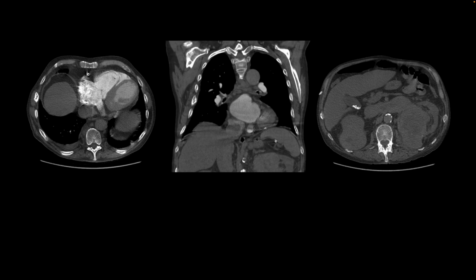This is our next patient where the finding is in the kidney, and they have a renal cell carcinoma that has grown through the renal vein into the IVC, and we see that finding over here. Also, the IVC is expanded. And so pay attention to abdominal organs. They may have a pathology which may lead to PE-like signs and symptoms, and patient may present with that and get a CT-PE study from the ER.